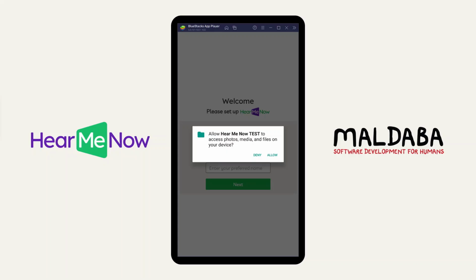You'll see a message asking you to allow access to images and other files on your device. To add pictures and other content types into the app, this needs to be agreed to, so I'll press Allow.